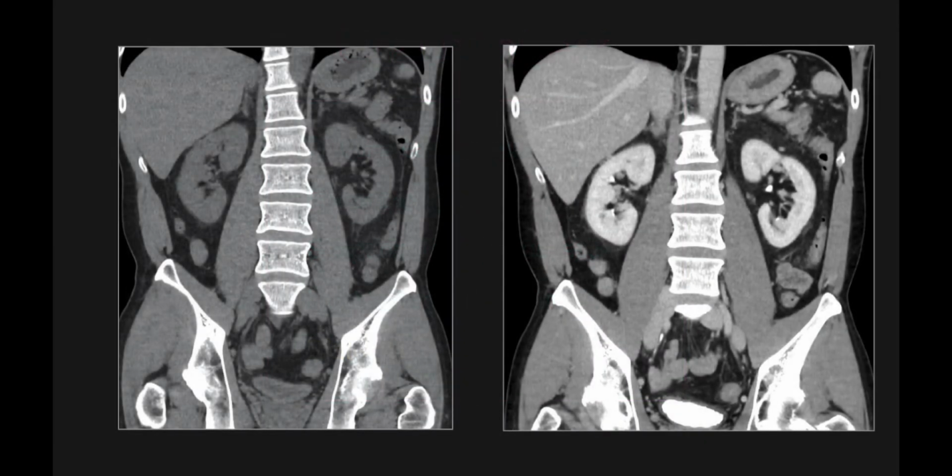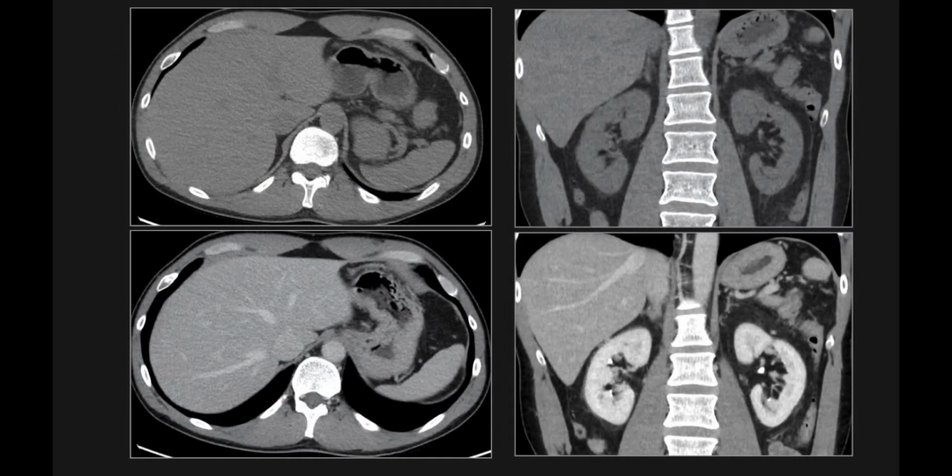Let's now discuss intravenous or IV contrast. When you do a CT without IV contrast, you get the contours of the major structures, but very little information about what is going on inside of them. With IV contrast on board, you can assess the enhancement, vessels, and have much greater confidence for evaluation of underlying lesions of the solid organs.